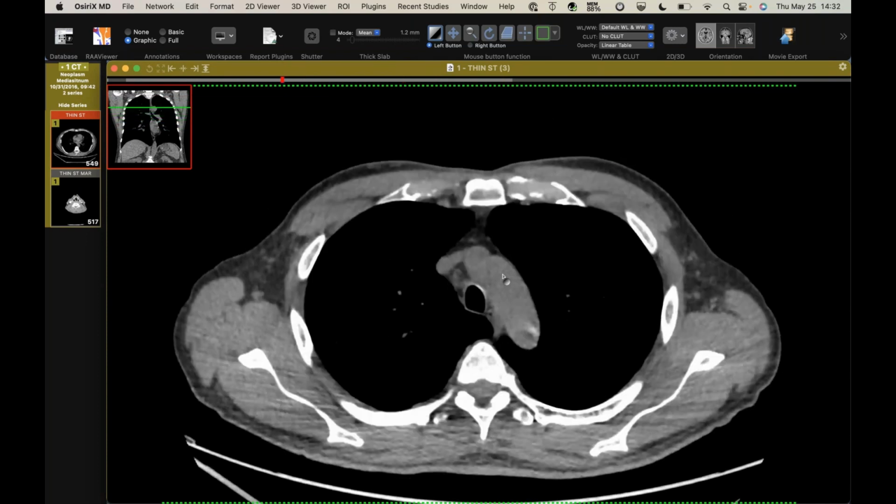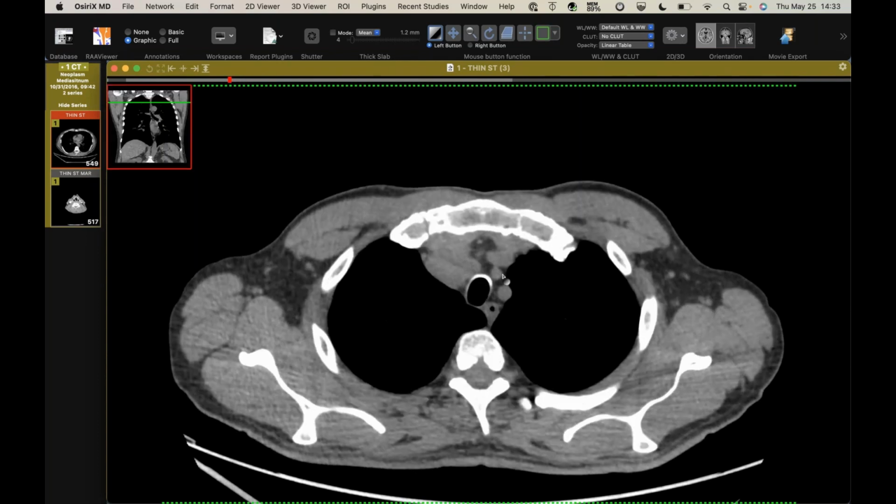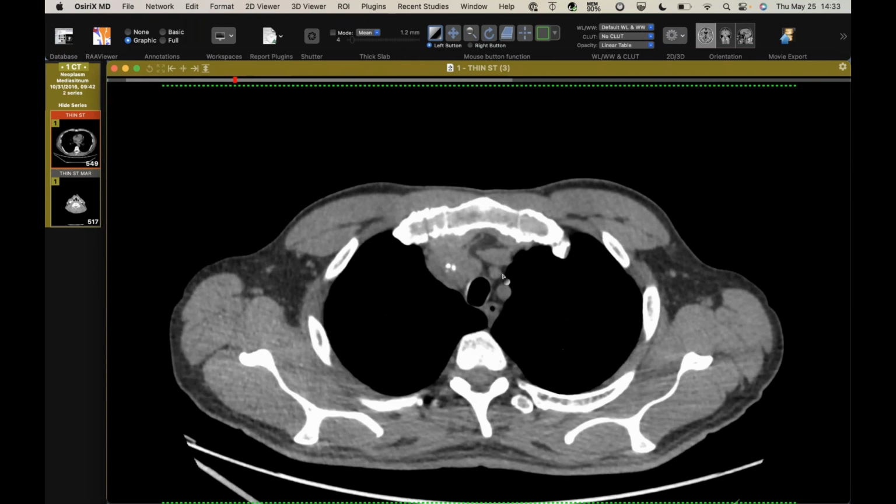I thought this might be, I mean, the calcium. I mean, we have so many calcified lymph nodes around here. I wondered if it was just in a pre-existing node, but I was wondering if this was just going to be like a lung cancer, a small cell, given how necrotic it looked on the next CT. Occasionally we'll get what looks like a primary, another type of lung cancer where we don't see the primary, but this came back as papillary thyroid carcinoma.